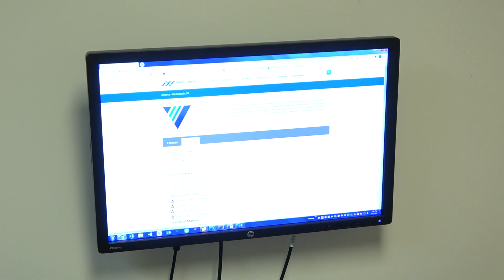You would want to download the software as well as the VPACs with the same version number on it. So usually it's this top one and the bottom one. These are the most recent versions that they have. They've got a Spanish version and the integrated version. So typically this one and this one are the ones that we use.